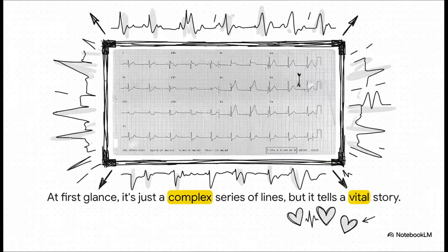Every single peak and valley you see here is a direct message from the heart. It's a real-time recording of the electrical impulses that drive every single beat, and it holds all the secrets to the heart's health and rhythm. This isn't just noise, it's basically a detailed report card.